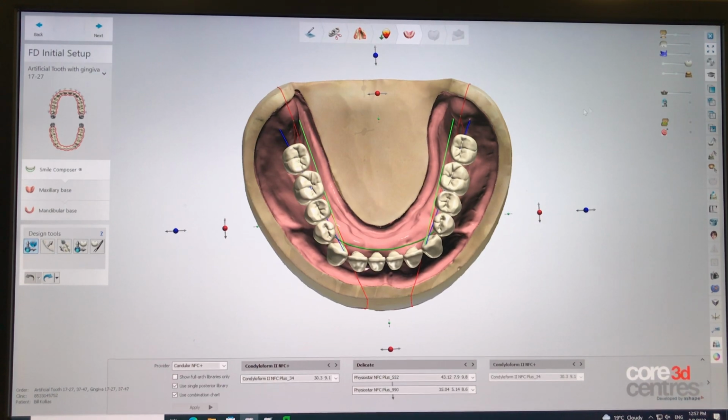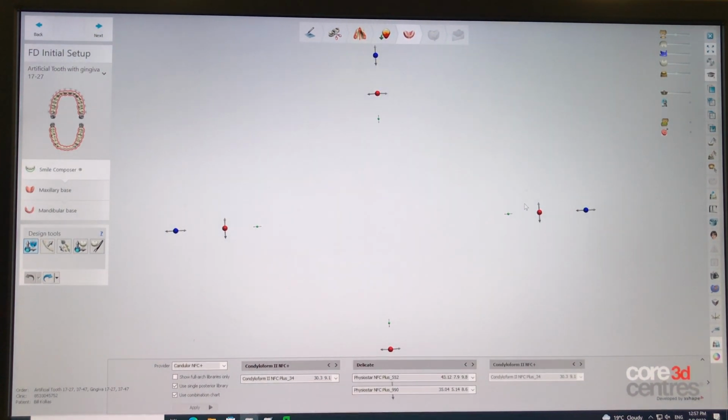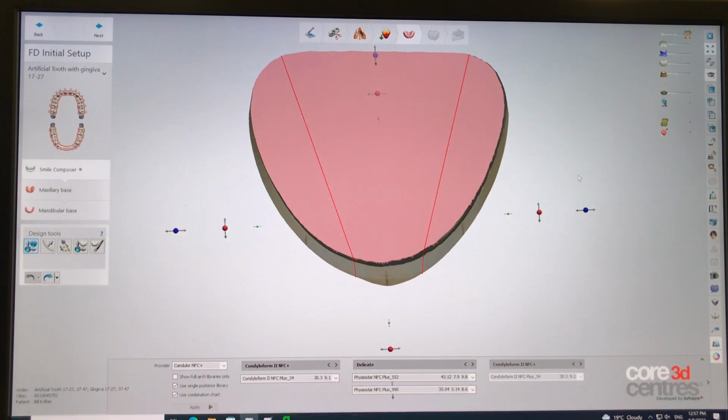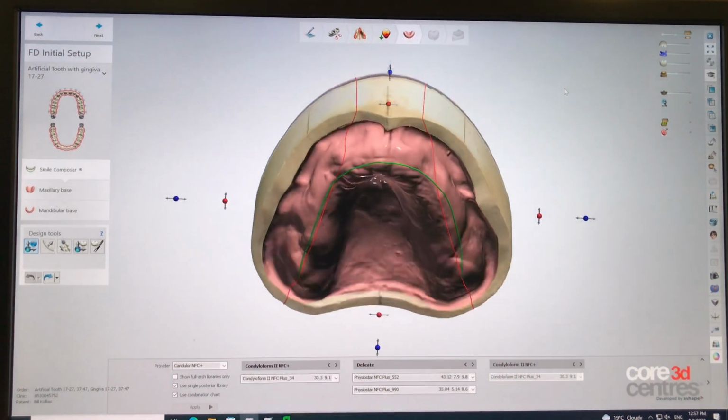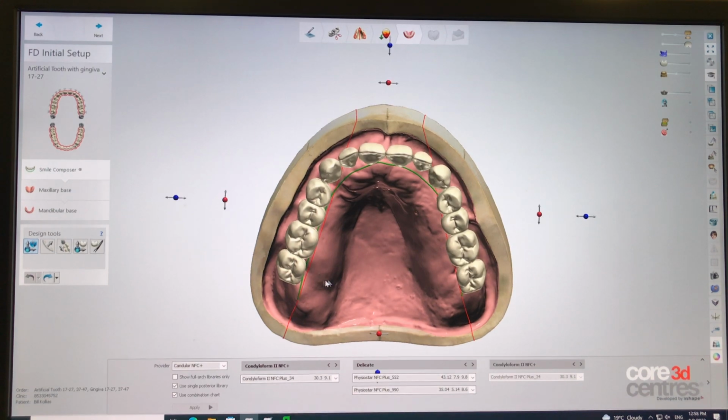But before we do that, let's move on. Let's look at the upper model, how the teeth relate to the upper model. So once again, I'm going to fade out the lower teeth, fade out the lower model. Now I have nothing. Well, it didn't go away. All I have to do is go back up here. This is my top model, this is my lower model. Go up here, drag this icon, bring my model back. There we go.